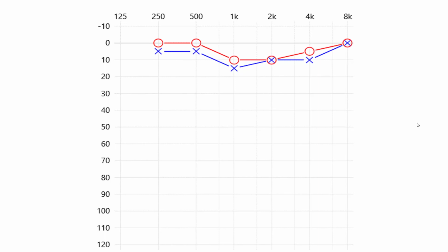Let's begin by looking at the axes of the audiogram here. First, let's look at the y-axis. As you can see here, this extends from -10 to 120. The measurement is in decibels hearing level, which is a scale describing the loudness of a sound, essentially. As you might imagine, smaller numbers mean softer sounds, larger numbers mean louder sounds.